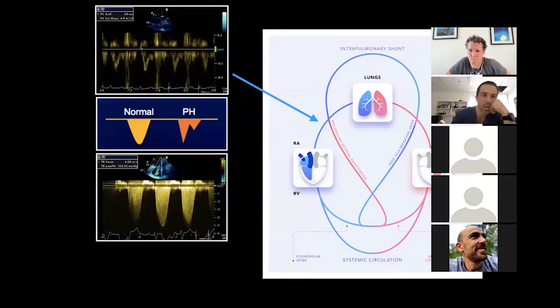Well, I don't know. Who are we up to? Lewis, have you got diastolic pulmonary artery pressure? And then Vishal, you can tell me about mean pulmonary artery pressure. So PADP you can measure from the PR end-diastolic Vmax. Excellent. And add on RAP or not? Yeah, add on RAP for all of those measures. Good man.